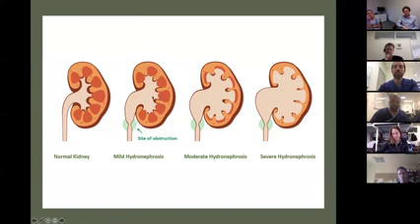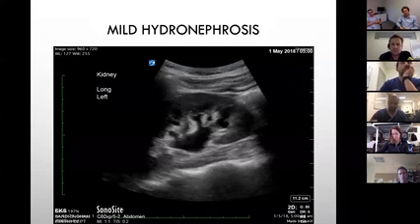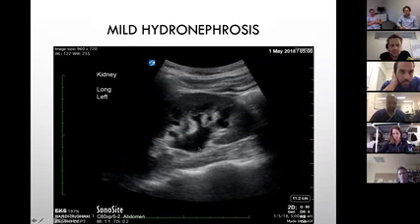All right. So mild, retaining the structure; moderate, the papilla is getting flatter, but the cortical thickness is still good; in severe, you're getting thin cortical thickness. All right, good. Let's see some images. It's already written there, it's mild. The pelvis is dilated. You still have the major calyceal system there, and your minor calyceal system there. You can see the cup-like papilla there. So the cup's not flipped the other side down. We're still going to call that mild.